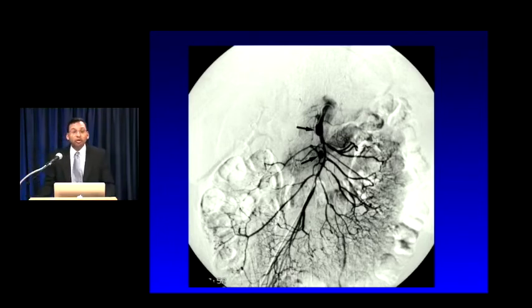This is a patient who has polyarteritis nodosa. Notice that not only is there a bigger aneurysm proximally in the vessel, every single one of these tiny branch vessels has tiny microaneurysms, and that's classic for polyarteritis nodosa.